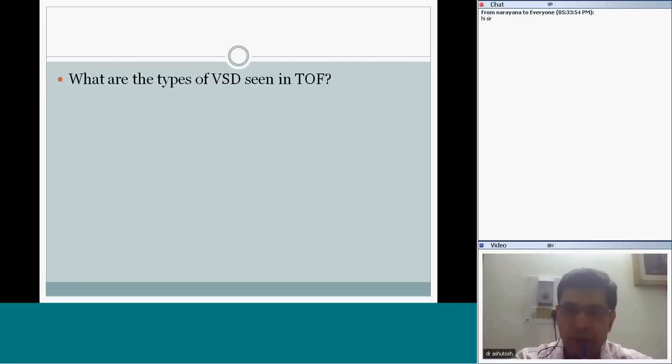Okay, coming on to the VSD, you've answered large perimembranous VSD. Now my question is, what are the types of VSD seen in tetralogy? When you see a tetralogy, what are the various types of VSD you would expect to see?